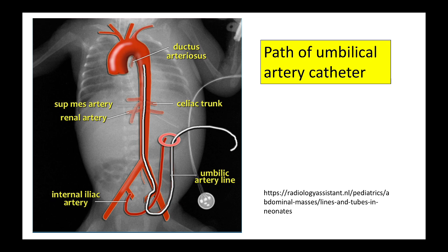Because the UAC has to go down before it comes up again, we generally have to thread the UAC in way more centimeters, normally nearly double the distance of the UVC.